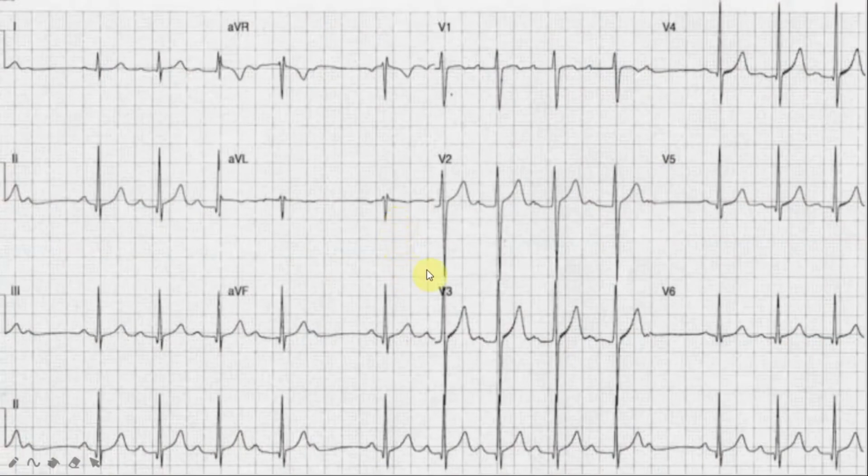Now this is another one, so let's do the second ECG. It is similar to the first one. There are some subtle findings, and Becky, could you please interpret this ECG in a very systematic way, just like you have done the previous one?